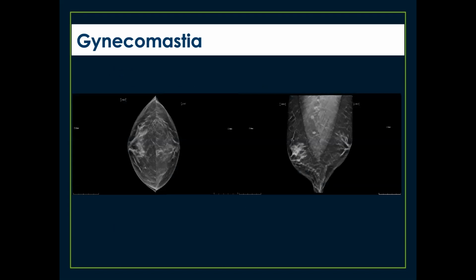So here's another example of gynecomastia, somewhat more advanced than some of the previous cases we looked at. The patient presented with symptoms in the right breast, where we see at least a moderate degree of fibroglandular tissue. And there's a milder amount of gynecomastia on the left side.